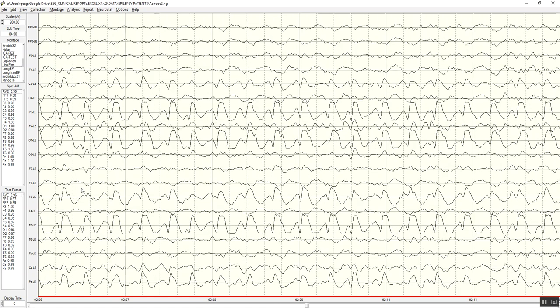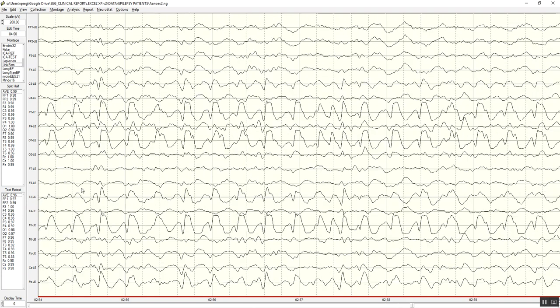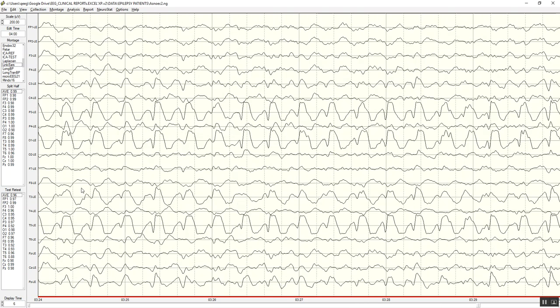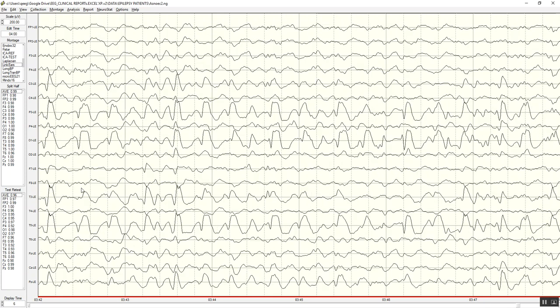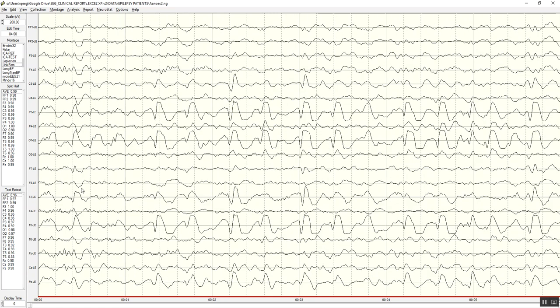dysfunction or epileptogenic process. They decided at the end of the day not to do the neurosurgery because of her age at 12 years of age and because of her adaptability over the years of being able to adapt to this event with her compensatory right hemisphere. I'm going to click home to go home. And because the extent of the epileptic focus was so large that too much tissue would have to be removed, and which would interfere with the quality of life that she had before surgery.